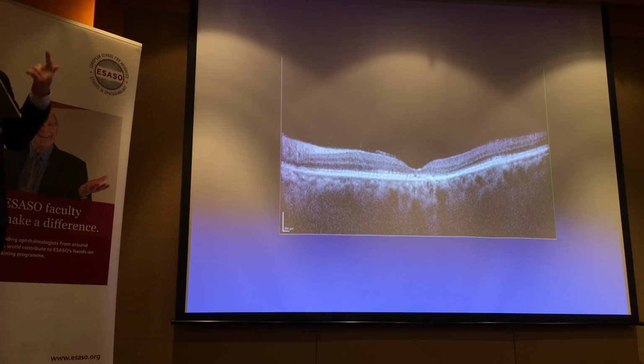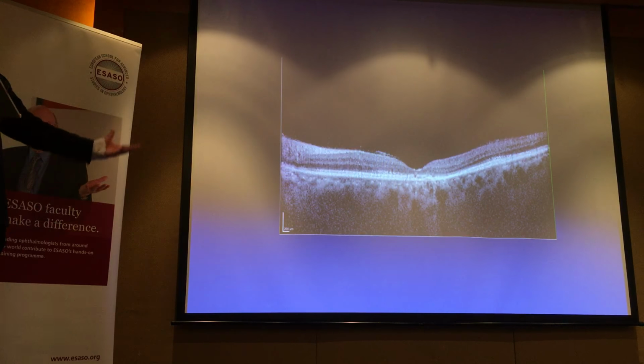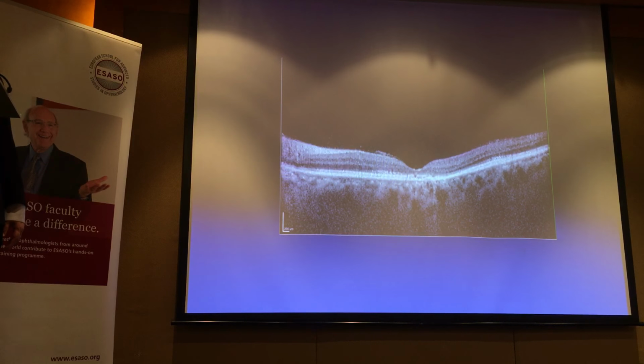So for example, a patient has visual loss and they're looking for edema fluid because that's the most common thing, right? And then I'll get a report. This patient referred to us, the retina is not thickened. And then I'll look at it, and in some cases, more severe than the toxicity case, there's only one little bit of ellipsoid band here because the patient has advanced RP or some other dystrophy, some other toxicity. So I once said to someone, no, it's not thickened. It's definitely not thickened. It's thin. So think of the opposite as well.